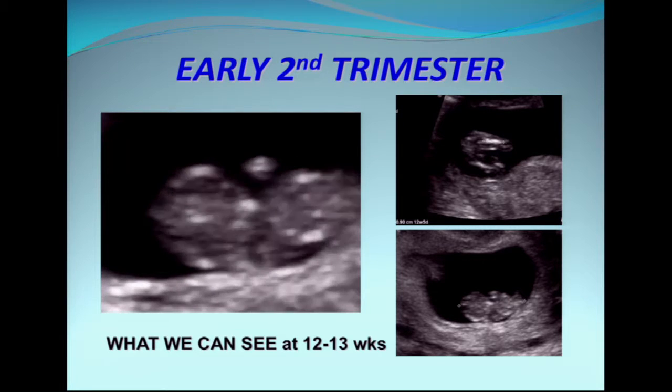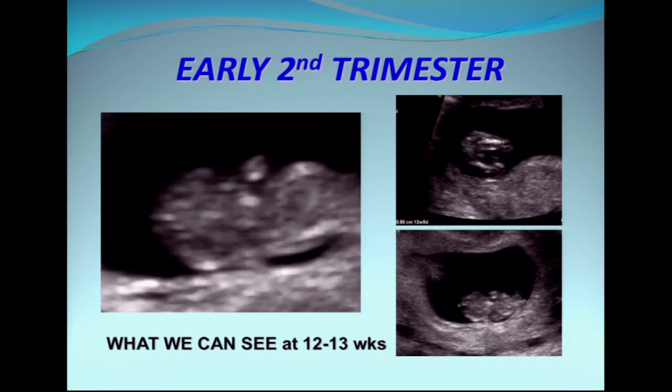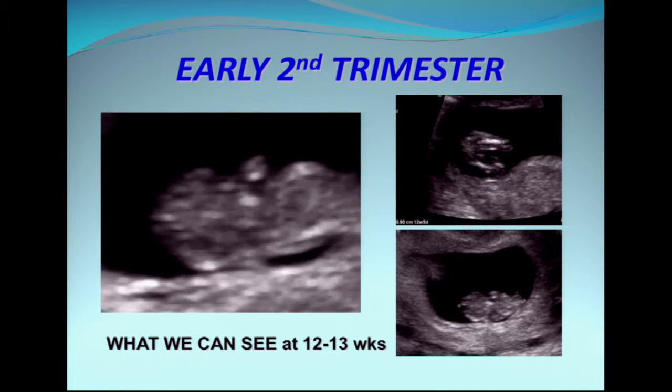The very first long bone we can measure in pregnancy is the femur, and there are nomograms from 12 weeks and beyond.